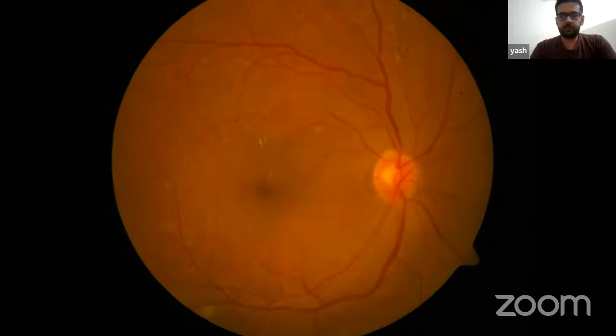If you were given this as a patient, then you are expected to see all the quadrants. Your diagnosis would then have to be in terms of non-proliferative retinopathy, whether it is mild, moderate, or severe. But if it is just this picture we are talking about, then you can only say non-proliferative diabetic retinopathy. Yes, sir.